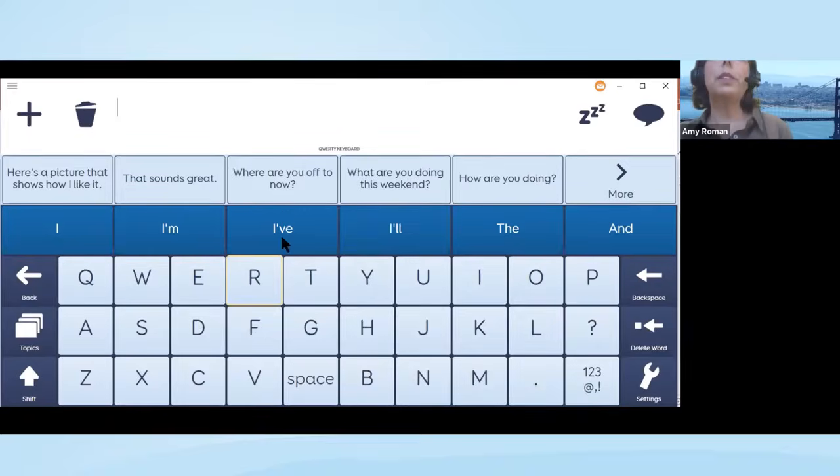Now, of course, this is something that you do want to pause occasionally because you don't want to have to select everything, especially if you're eye gazing. You end up wanting to look at your page without selecting anything, so you can quickly select this icon, and it'll pause your page, and you can look at everything without making any selections. And when you're ready, you go back and toggle it back on. It turns red when it's paused. Let's see if I can do that. There we go. Over here, we've got the clear button.